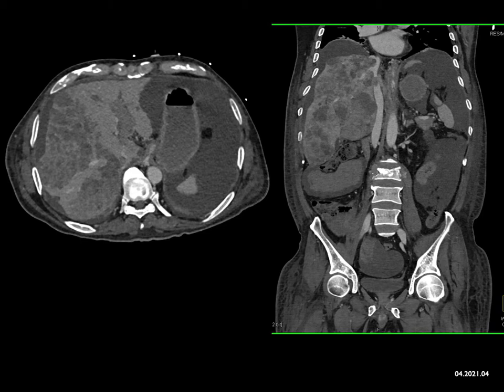Okay? Now, you could say lymphoma, but lymphoma can be infiltrating, can see duct dilatation, can be solitary or multiple masses. I don't really like this for lymphoma. I also see a lot of ascites, which I typically don't see with lymphoma. Also, as I look carefully in this case, the patient's extensive liver mets could be the cause of the patient's pain, but if you look inferior to the liver, you see a hematoma inferior to the liver.